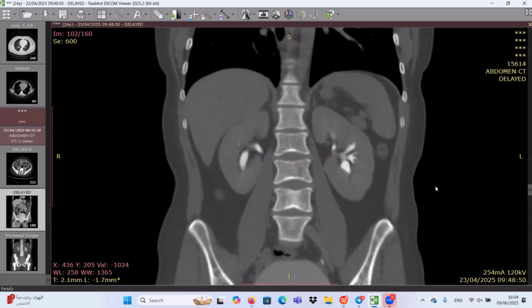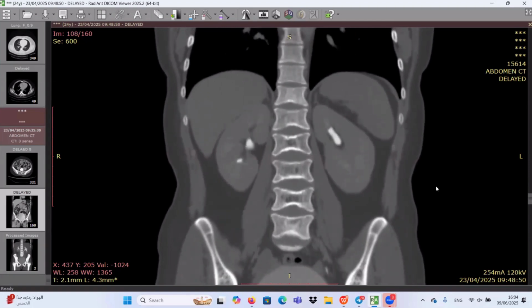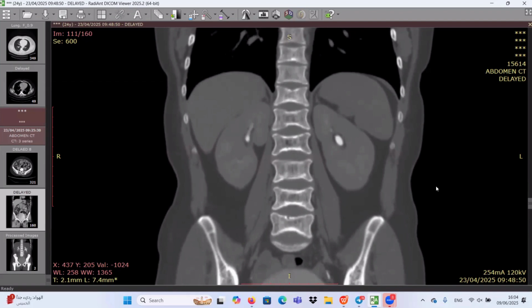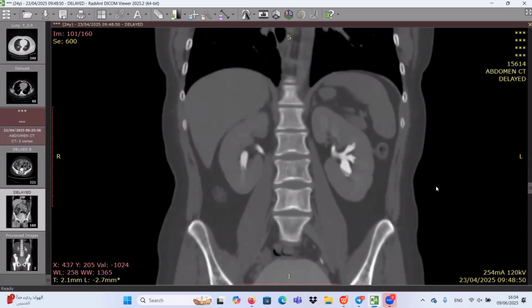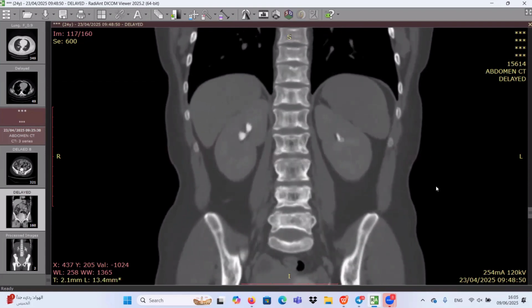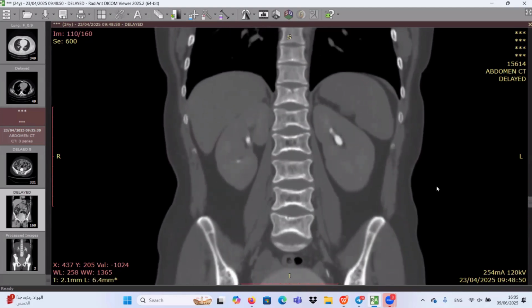Why did you think of papillary necrosis? Because of the abnormal fornices. Or it would also be medullary sponge kidney. How can we differentiate medullary sponge kidney? Given the brush appearance of the calyceal, the brush appearance of the medulla of the kidneys, we don't have any brush appearance. Symmetrical, bilateral, we don't have.